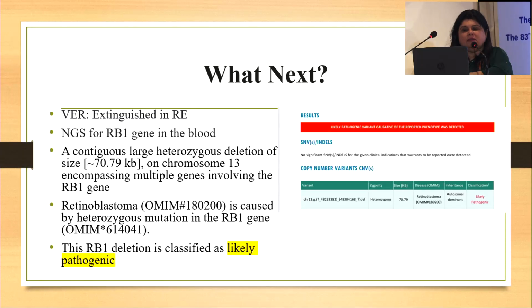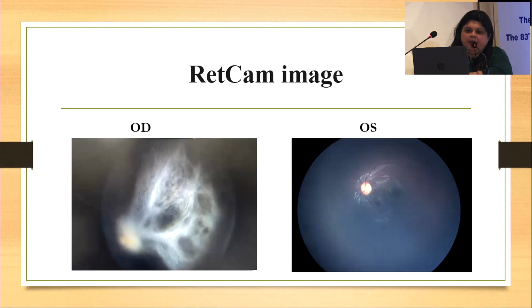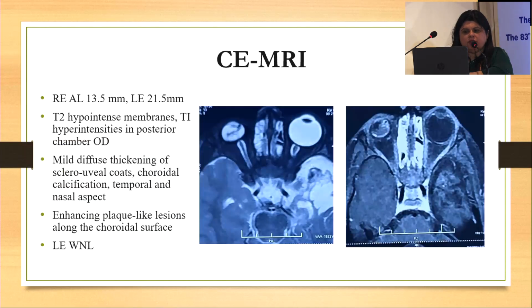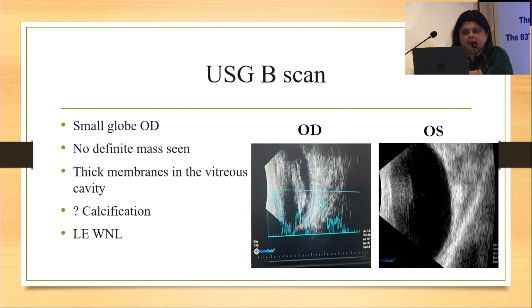Well, a photograph is limited. The question is, is it a diffuse infiltrating kind of retinoblastoma, if at all? So this was a 3-year-old child, not an older child. The anterior segment was also normal. There was no inflammation in the anterior segment. And there was some doubtful calcification on ultrasound. So these were some of the features that were going against a diffuse infiltrating RB. But yes, with a thickened membrane like this, we would definitely consider a diffuse infiltrating RB as a probable differential.